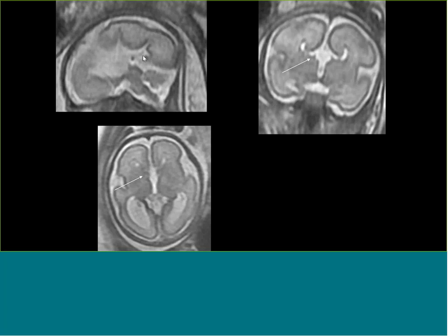So that's the easy one, and this is an agenesis of corpus callosum that had otherwise a normal cortical structure as far as gyrification for age, and even the layering, you can still see a little bit there.